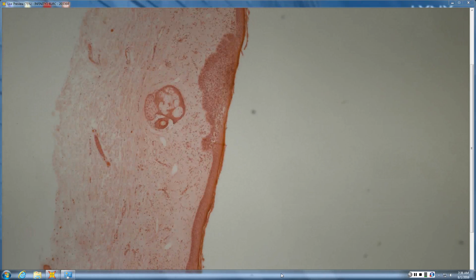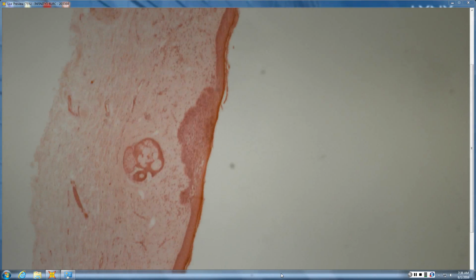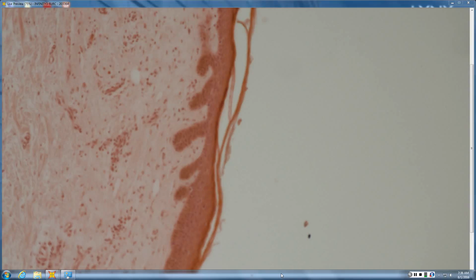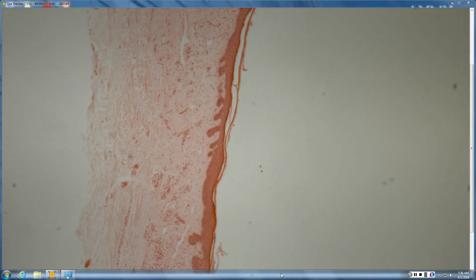Yep. And now tell me about the margin of the basal cell. So normally with the basal cell, if you have that fibromyxoid stroma to the margin, then it would be positive. So yeah, your point is beautiful that you're looking at not just tumor, because this is a superficial multifocal BCC.